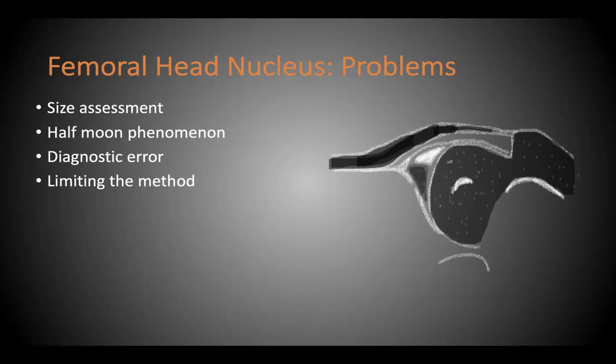And again, the position of the ossific nucleus can be highly variable on an ultrasound. It may not always be in the standard plane of your ultrasound. The ossific nucleus may be slightly eccentrically placed. So you cannot determine hip dysplasia based on the location of the ossific nucleus. For example, when we do an X-ray, we compare the location of the ossific nucleus with respect to the Hilgenreiner and Perkins lines.